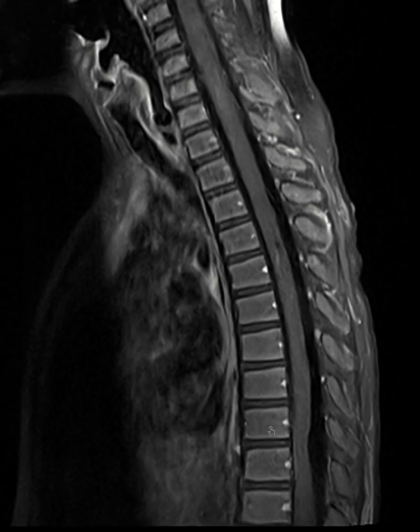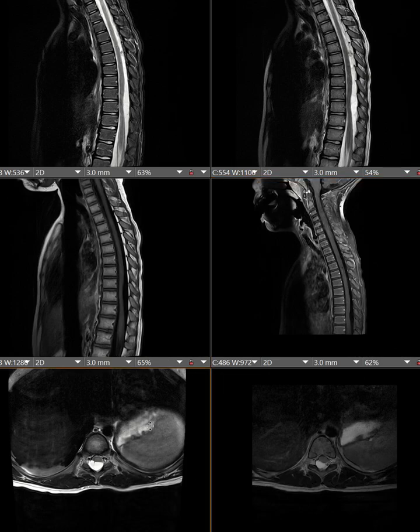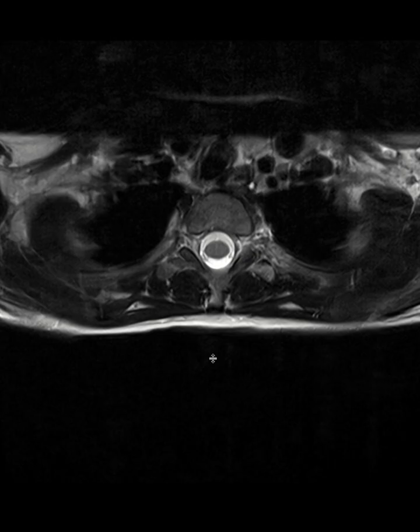Again, as you see here, we don't have any abnormal enhancement, and the lesion is completely iso-intense with the CSF. So we are dealing with some sort of lesion that doesn't have any specific walls around it. It's not very well defined, but we see mass effect and indentation on the dorsal aspect of the cord, and that's how we know that there is a mass there. The thoracic cord is usually a little bit ventrally displaced, but the way we can differentiate whether there really is a mass or just normal displacement of the thoracic cord is by the indentation and mass effect on the dorsal aspect of the cord.